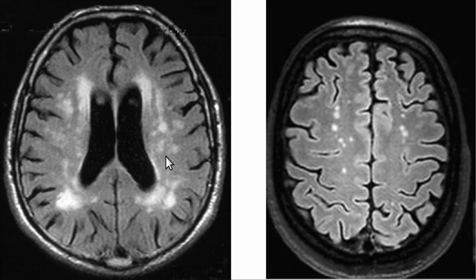Okay, now this is a set of images. This is an axial, transverse image at the level of the lateral ventricles. This is called the corona radiata in here. Okay, this is above the ventricles. You're in the center here, and it's shaped like an oval. So this is called the centrum semiovale at this level.